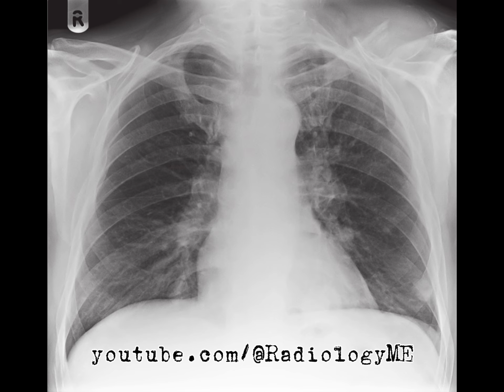At this point, the Viva examiners may test my ability to balance differentials. Could this be something like a primary bone tumor? I'd acknowledge that possibility and explain it's unlikely to be a primary bone tumor like an osteosarcoma or Ewing's sarcoma, because those typically present with more localized bone destruction, and we don't see the pattern of pulmonary nodules like this with primary bone tumors. Plus, the cavitation in the nodules and the bulkiness of the left hilum really push me away from a primary bone lesion.